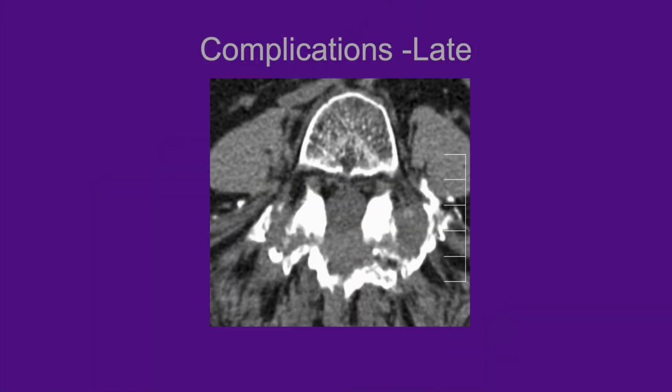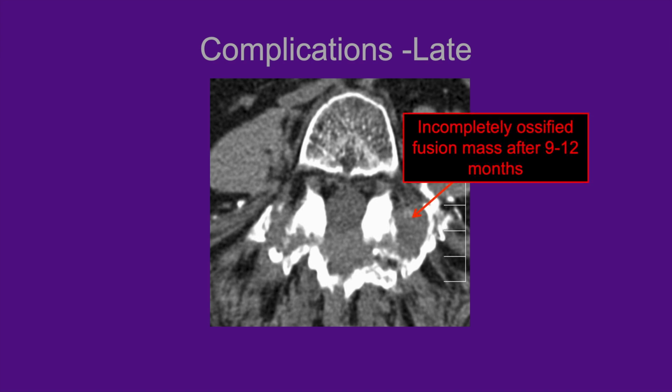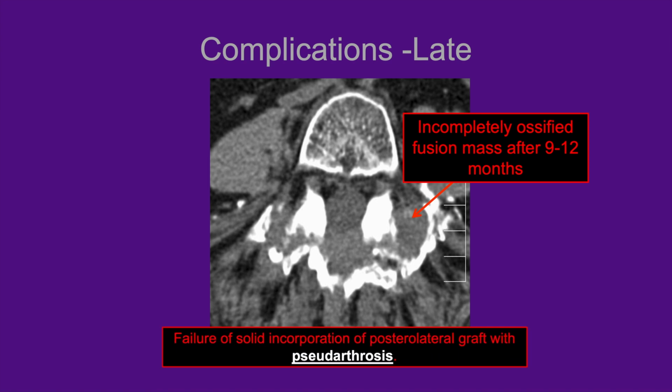Another late complication is pseudarthrosis or failure of adequate fusion. Here you see poorly defined and developed fusion mass 9 to 12 months after the surgery.